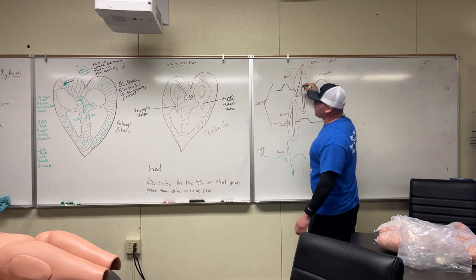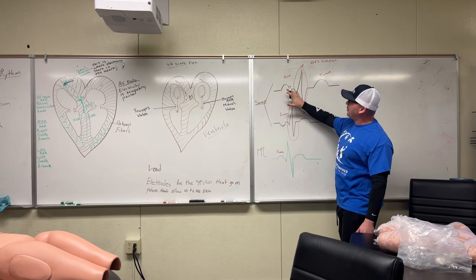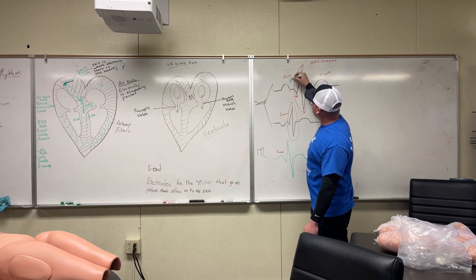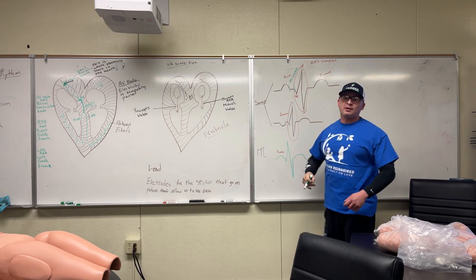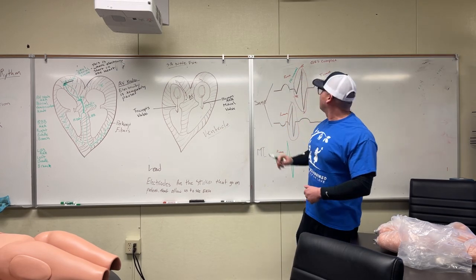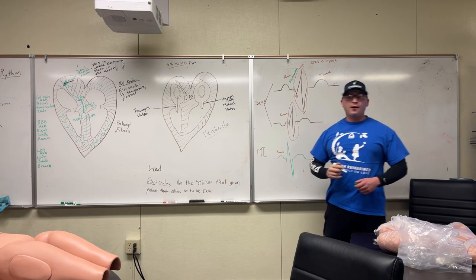I might be a little off, but we'll double check later. But for right now, just look at this line we're worried about, and it'll make sense. PR interval. And if I'm wrong, I will correct after I'm done with this video. Sometimes even instructors get it wrong, but as long as we fix it, it's all right. PR interval. It's between the P and the big R.